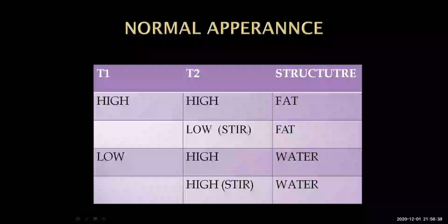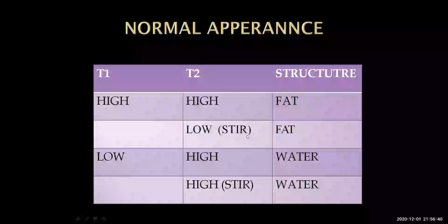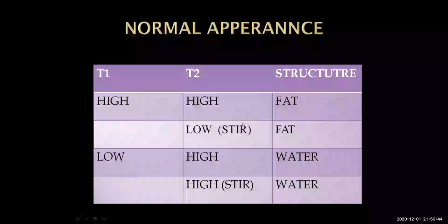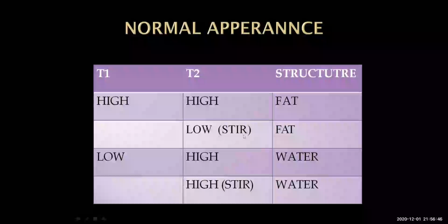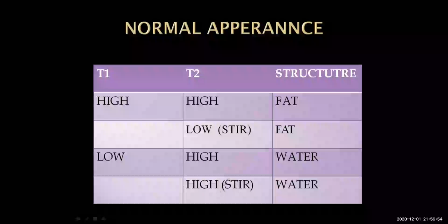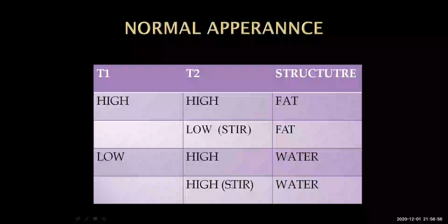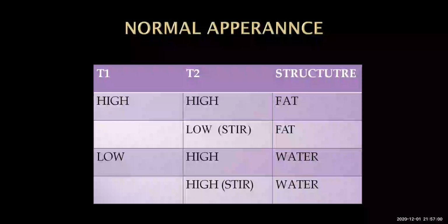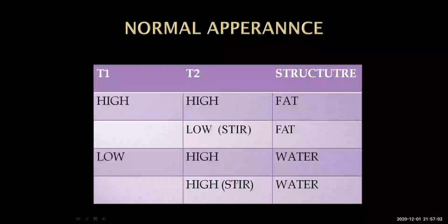They take a view with certain physical formations. Usually they suppress the fat, what we call a STIR view. This is STIR view. It shows you the fat as black, that is to say low intensity, while the water is still white. That's why, if you have any post traumatic case and you find a flare, meaning the whole MRI film looks white, usually this is a post traumatic.